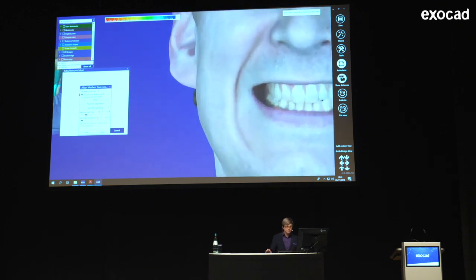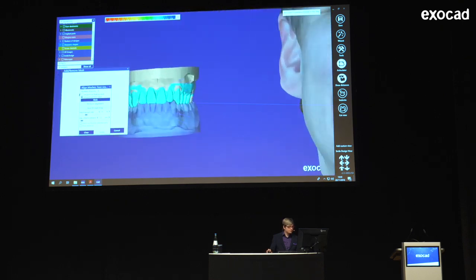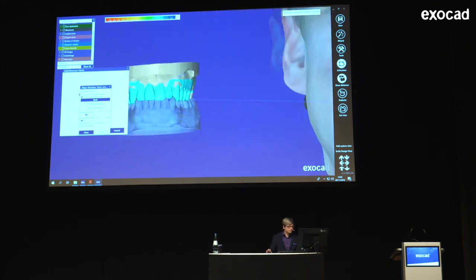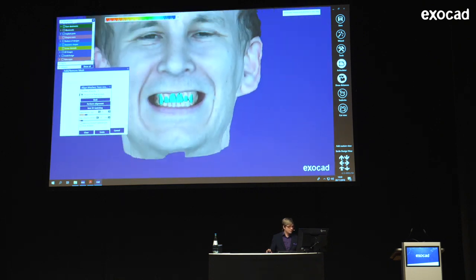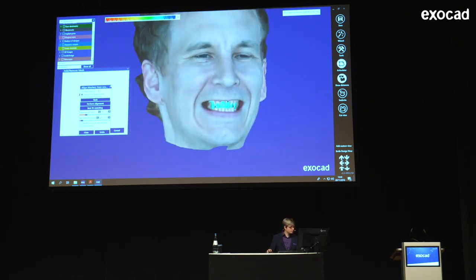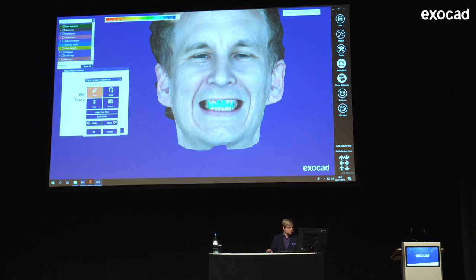But the trick for this is not to design one line of points, like you would maybe do, just take the incisal edges here, but actually create kind of a triangle of points. So I'm performing the alignment, and it looks OK. And I have another option, the face correct placement, where I can move the face scan around, scale it, rotate it. I'm not going to do it because the alignment looks OK for me.